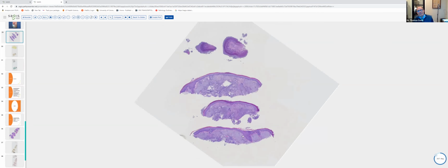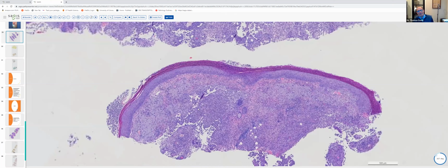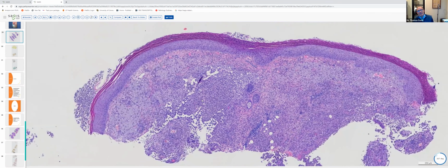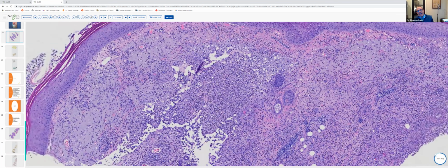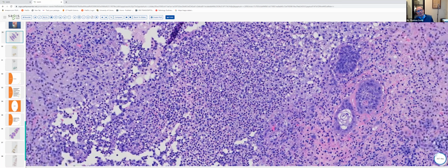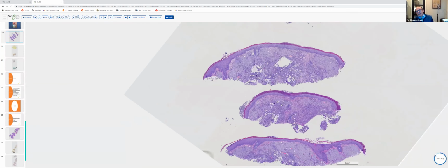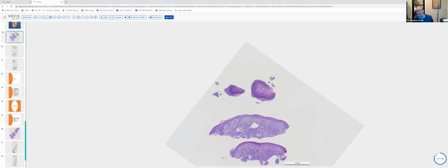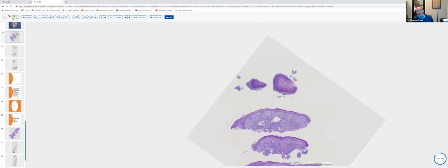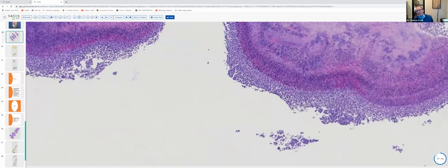And what we see within the dermis, kind of embedded in granulation tissue here, is a large abscess. There's a large collection of neutrophils here in the dermis surrounded by granulation tissue and granulomatous inflammation. And if you look at the top, you can see that what fell out of the dermis here was a very large grain, okay?